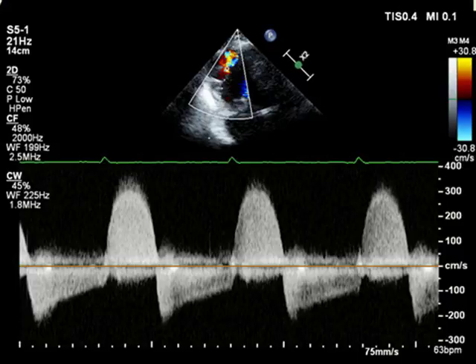Now, how did this happen? Well, sometimes when you operate on the mitral valve, you can ligate the left circumflex artery, and patients can have these for years and be completely unaware of it, completely asymptomatic, and this can sometimes be detected on a routine transthoracic echocardiogram as a consequence of surgery that happened a long, long time ago. And fortunately, in this patient, the dam never burst, as it were, because if you see a pseudoaneurysm, one has to worry about the potential for acute pericardial tamponade, which doesn't usually bode well for patients.